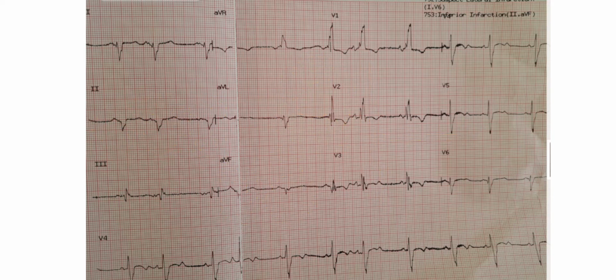So what do we know so far? We know that the heart rate is irregular. We know that it's 66. We know that the cardiac axis is an extreme axis deviation. Now, we are going to go to the pathology. I think all of you can see where the pathology is in this ECG. But let's check if the rhythm is actually a sinus rhythm.